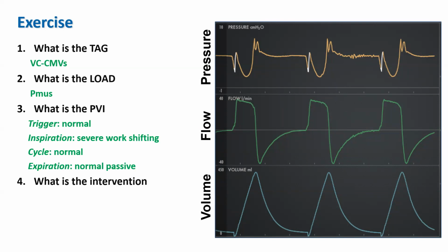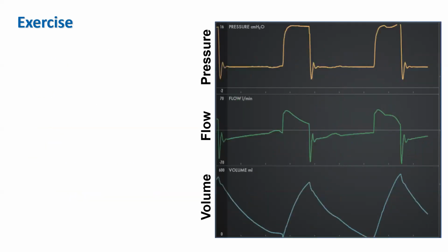So what intervention would you do here? What would you recommend? How about sedation and paralysis if you couldn't address the reason why this patient was doing this? Or maybe they just need to be extubated. It all depends on your clinical assessment of the patient at the time.